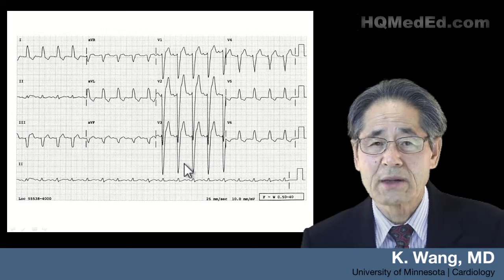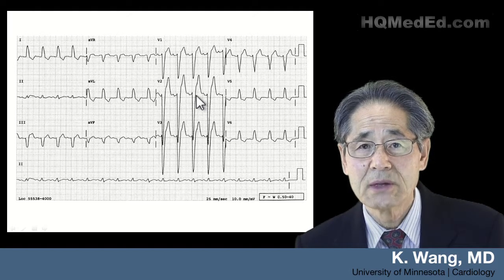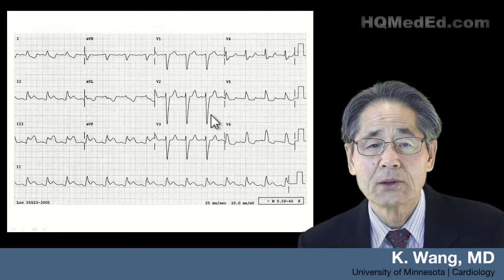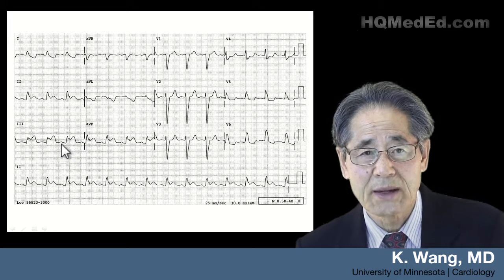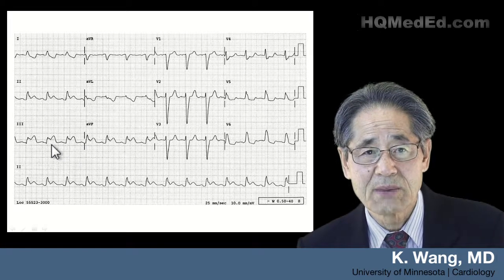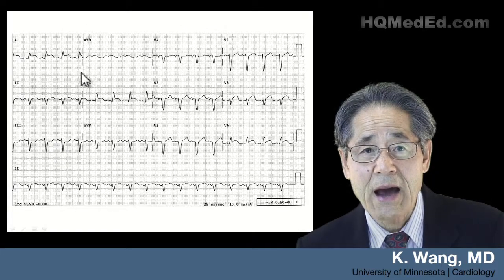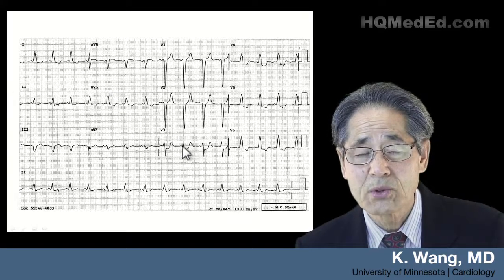Left bundle branch block is another cause of ST elevation, especially in V2. This patient has about 8 millimeter ST elevation, but no infarction. Wouldn't it be nice if ST segment can manifest concordantly with the QRS, like here, STEMI of inferior wall, STEMI of the high anterolateral wall, STEMI of the posterior wall registered upside down.